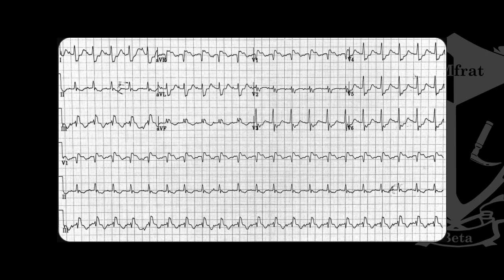In this question, we were faced with a 78-year-old male with sudden onset chest pain and shortness of breath. The question was posed: what's the axis, and are you going to activate the cath lab for this patient? This is actually a right axis deviation for this patient, and we'll get into the STEMI situation a little bit further down.